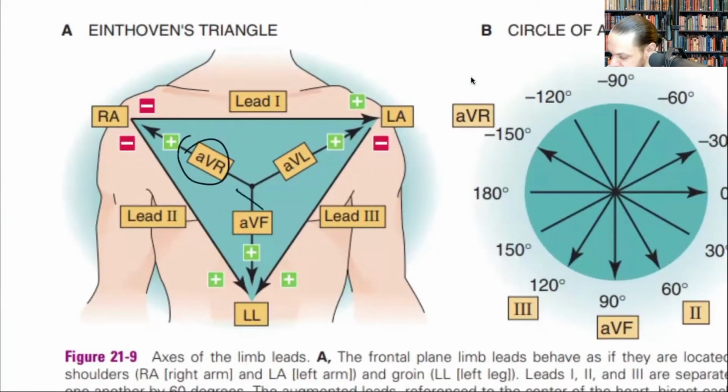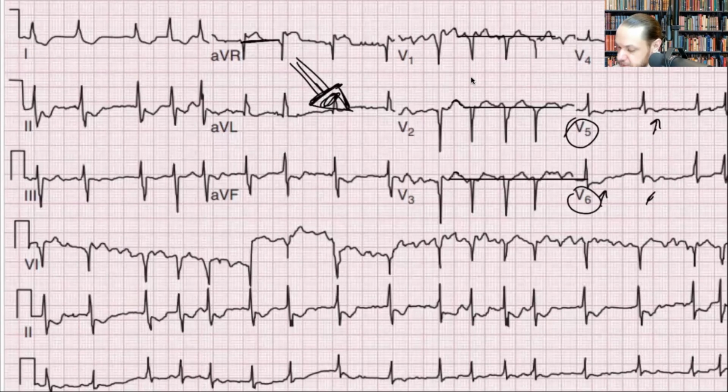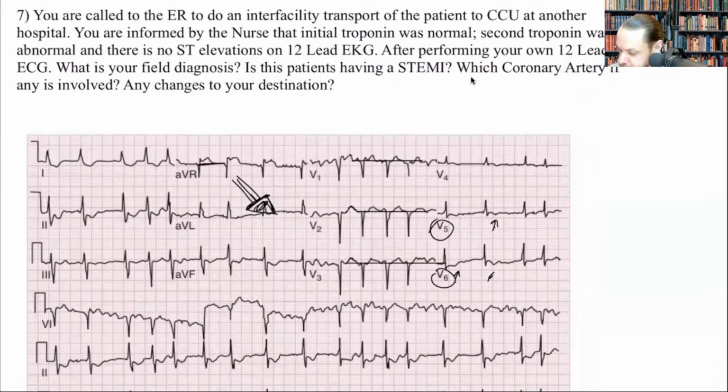A signal of the cardiac EKG that's coming down should normally give you an inverted shape, but it doesn't give you an inverted shape in the setting of a STEMI. In the STEMI, this is elevated. So this person is actually having a STEMI, because they have an elevation. So this is still a STEMI. The lesion involved, because of these T-wave inversions, is probably the left coronary artery.